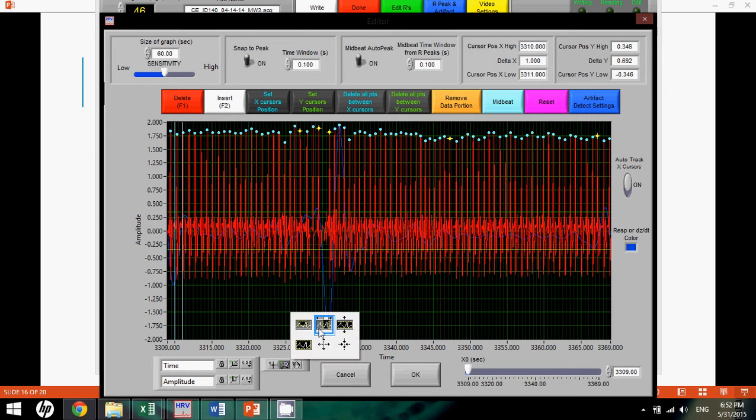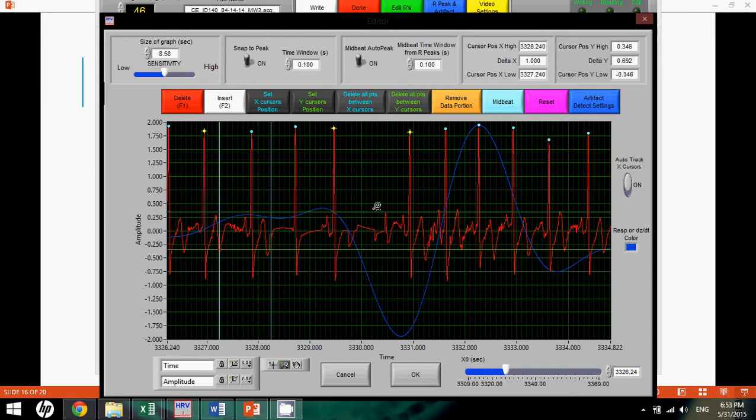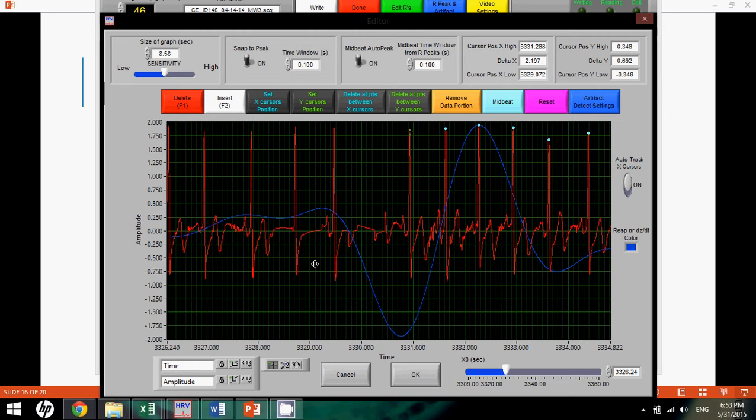Okay, again, we're going to go ahead and zoom in on that process. Just zoom in here, and you see that there's no data there. The reason why this is the case is simply because when you're collecting the data, one of the machines is trying to talk to the other one, and it doesn't always do this properly. Basically, it's like when a boyfriend ignores his girlfriend or something along those lines.